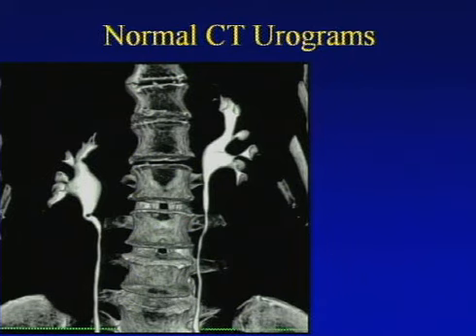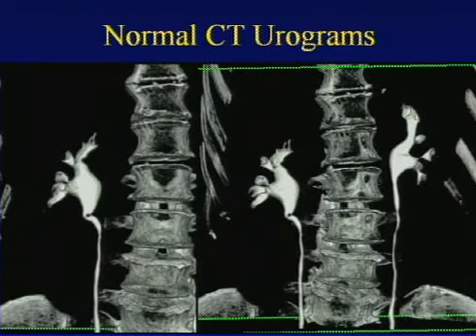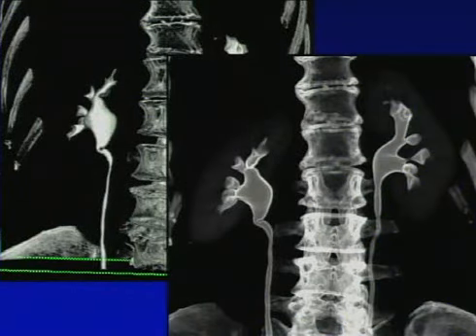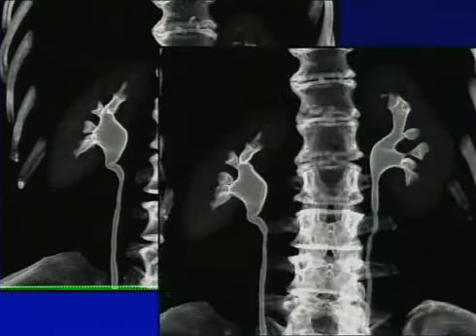Compression paddles, are they helpful? They can be used. Some articles have found them helpful. Giving patients Lasix, you could do that, but it becomes more complicated, and I haven't seen the gain. And here's just some simple examples. So one of the key things, of course, we commented, visualization. Here you're looking at the ureters like they're classic IVPs, very opaque. And then we'll change it to where the ureters and pelvis are transparent. This transparent projection works very nicely for looking for smaller polypoid lesions.